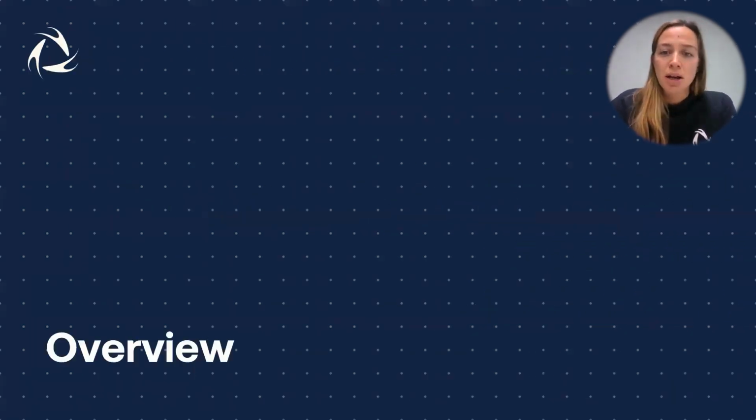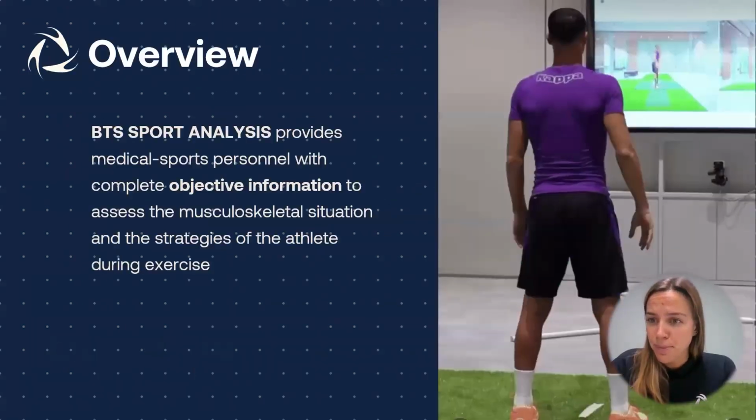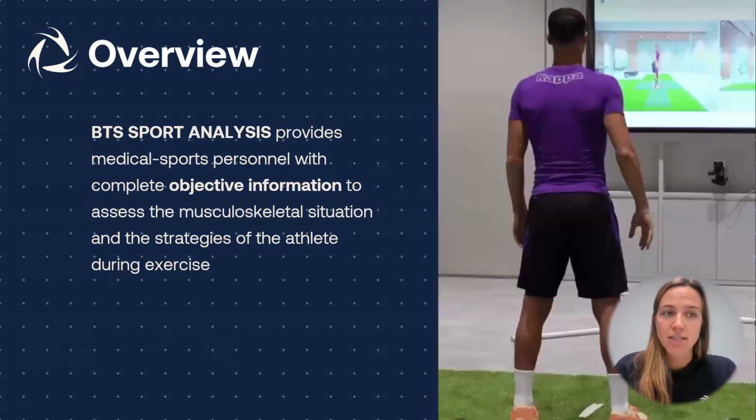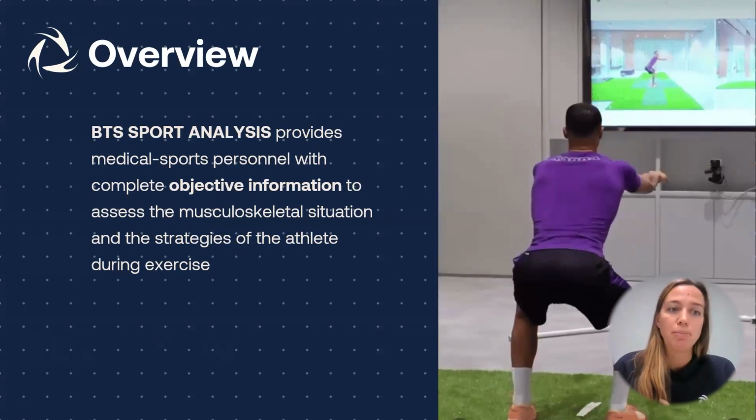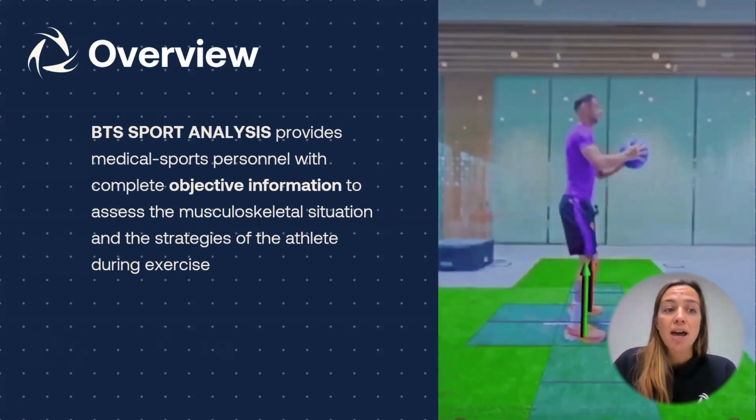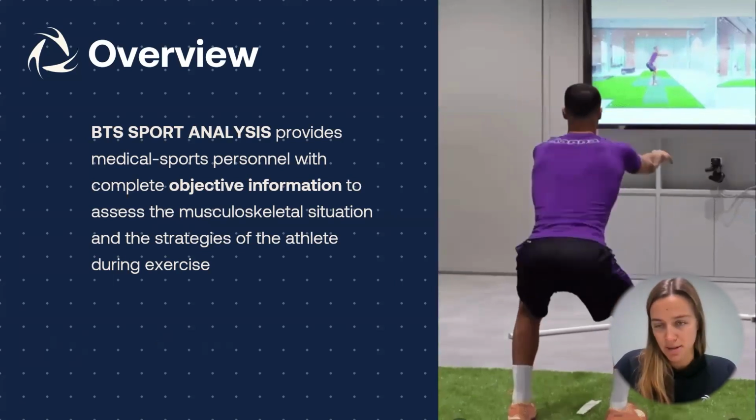So first of all, regarding the overview, BTS Sport Analysis provides medical sports personnel with complete objective information to assess the musculoskeletal situation and the strategies of the athlete during the exercise.